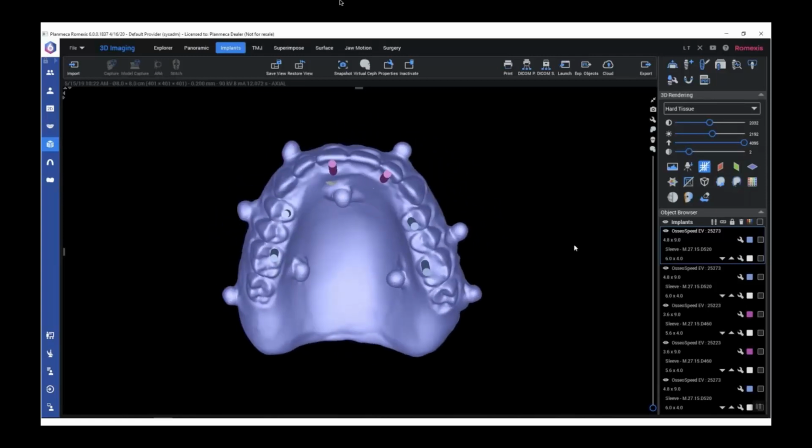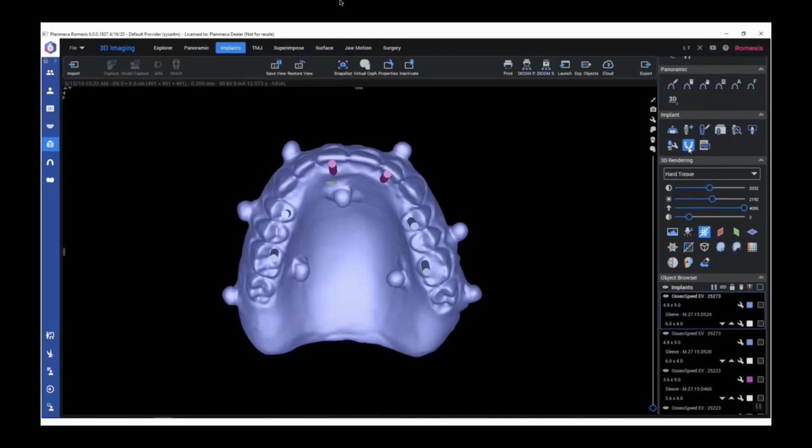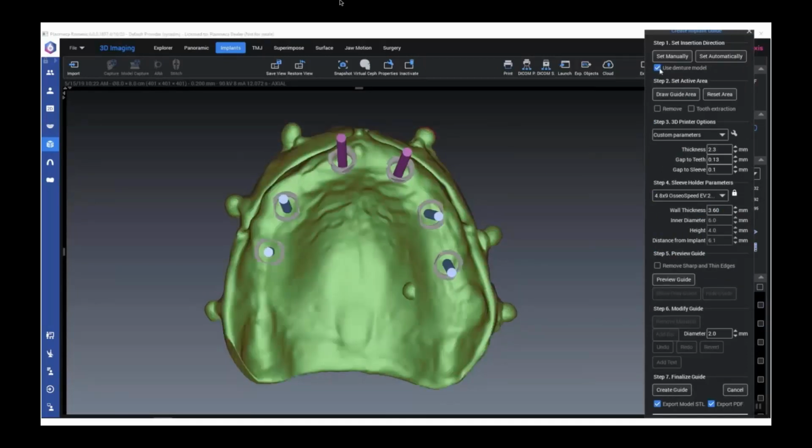And like we have a tooth removal feature, we also have this denture feature, which essentially what it's doing is it's taking the intaglio surface of the STL image of the denture, and it's embedding that or creating an inverse image of that.